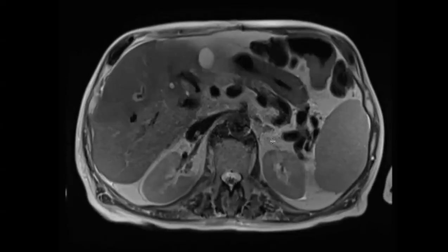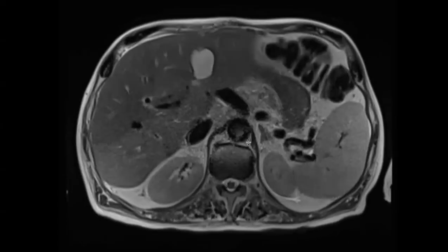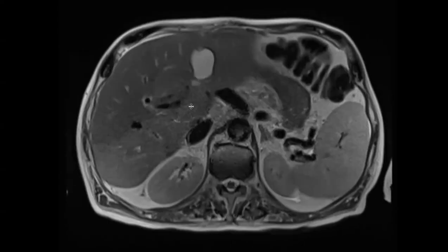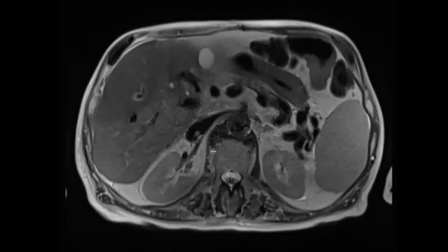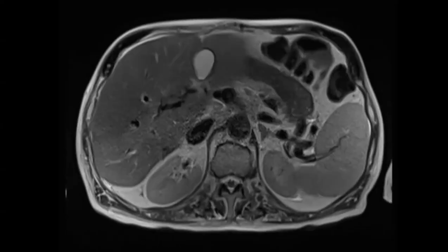Because I said PTLD, you did not seem convinced. My other thought is because the portal vein is gone. I don't know how long after the portal vein was gone this scan was done. So are these collaterals? Is this mass-forming cholangiopathy because of cavernous transformation? Is it enhancing slowly and steadily like fibrous tissue? Is it fibrous tissue? It is T2 dark.